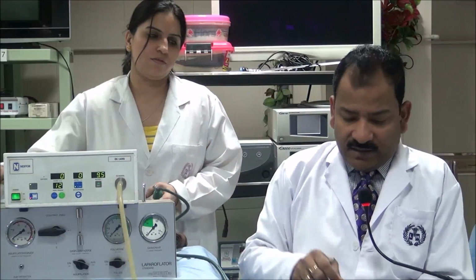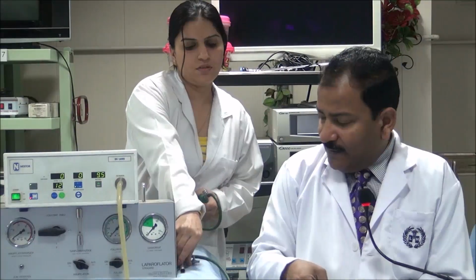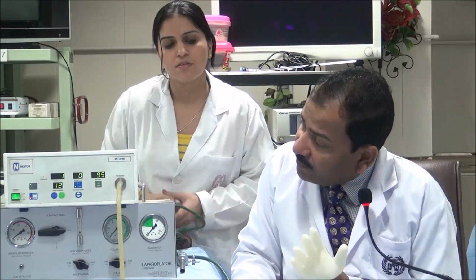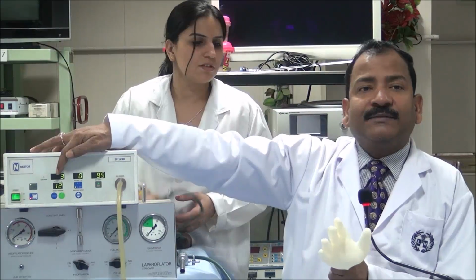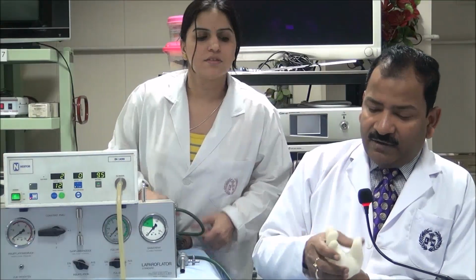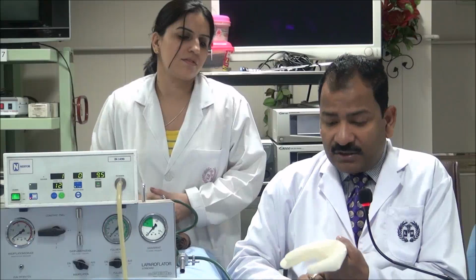If I attach both of them to the other cannula, then automatically it will give you the real pressure. See, once she is pumping, it is also increasing. Did you see that? So you can attach this tubing to the other cannula and it will give you the pressure, see, it is increasing now here. That way you can control it, she can control.